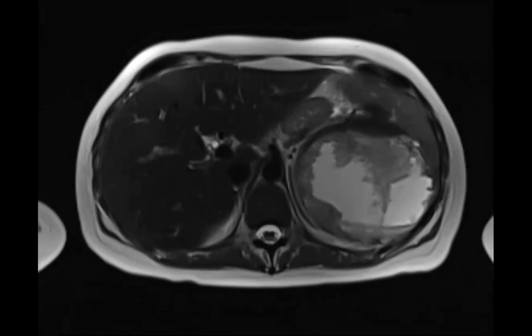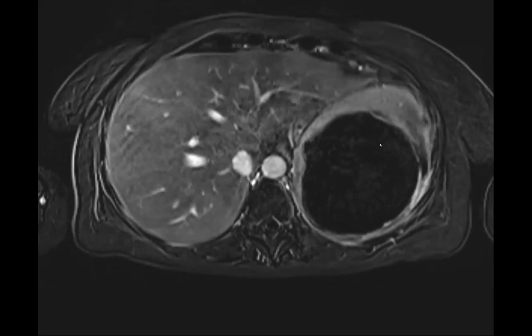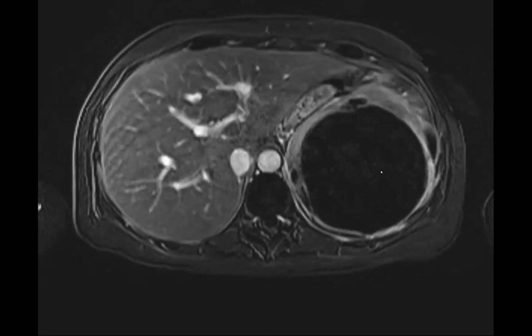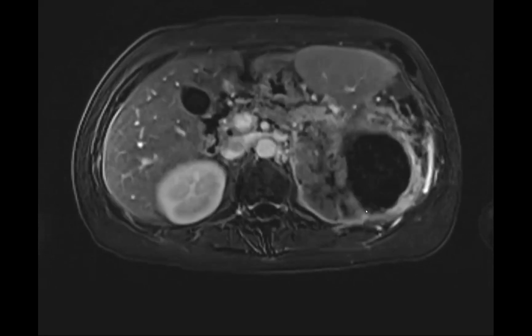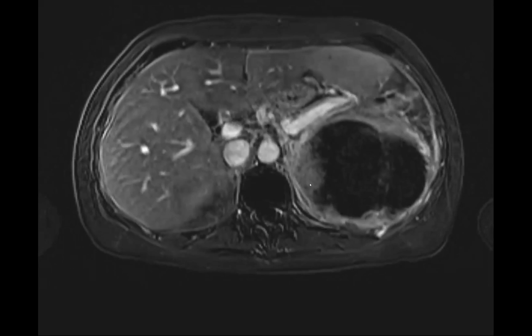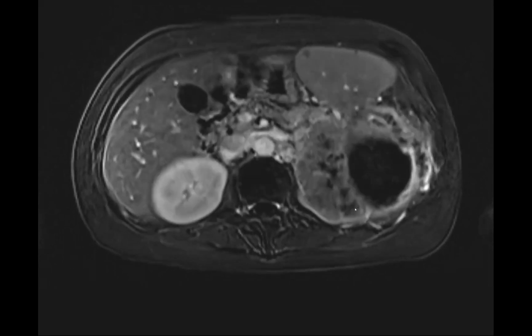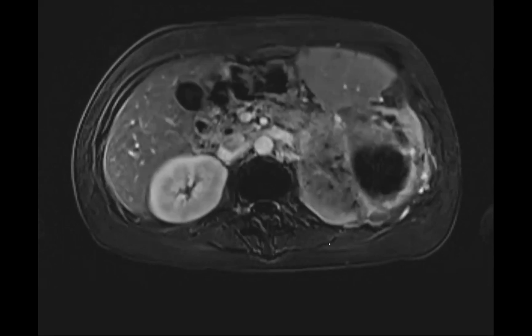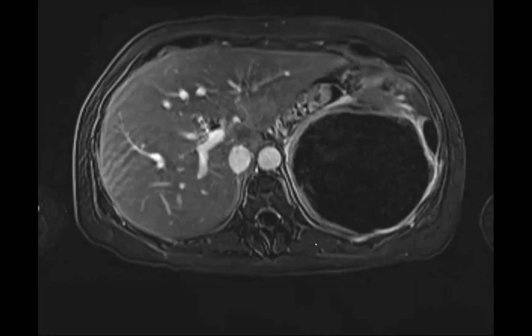I'll actually just jump to the subs. So most of this thing was still probably necrotic tumor that's got super infected, no enhancing components here, but just look carefully. That nodular part that we saw previously basically busted out and grew into this large mass. They eventually biopsied this and resected it, and this was all squamous cell carcinoma. So wow, yeah, it was a mystery case for us.